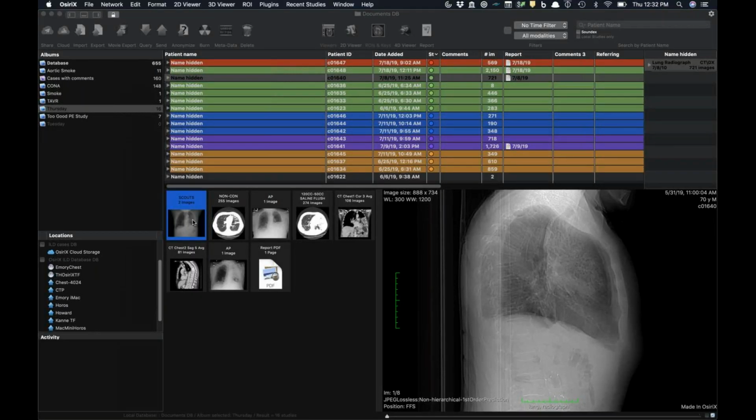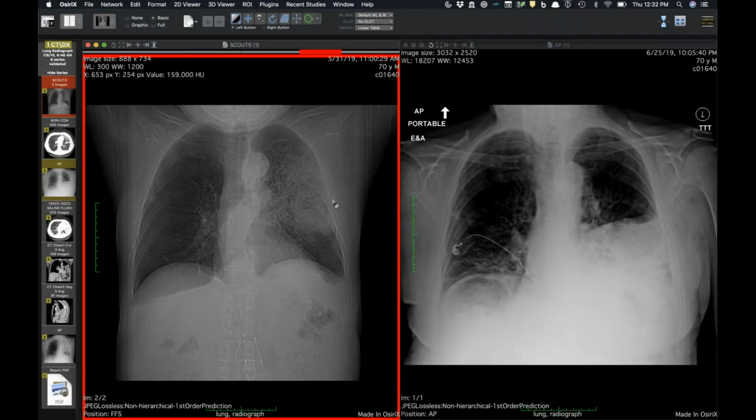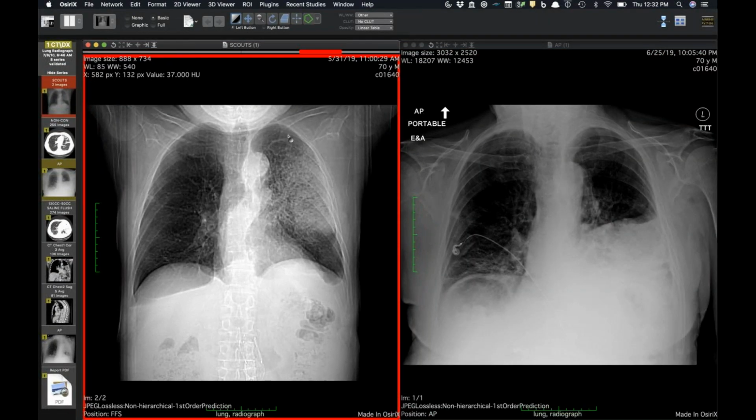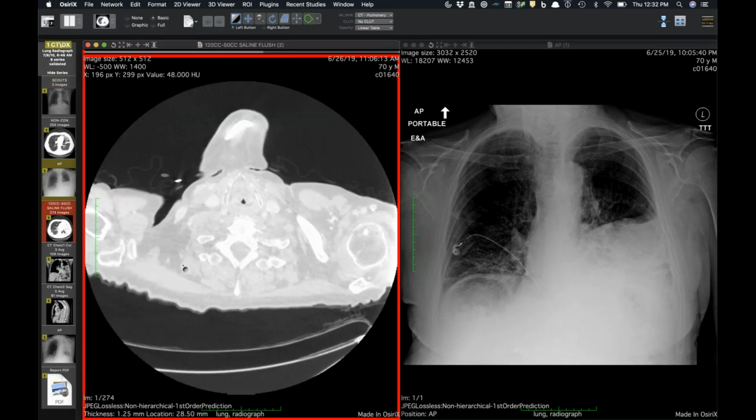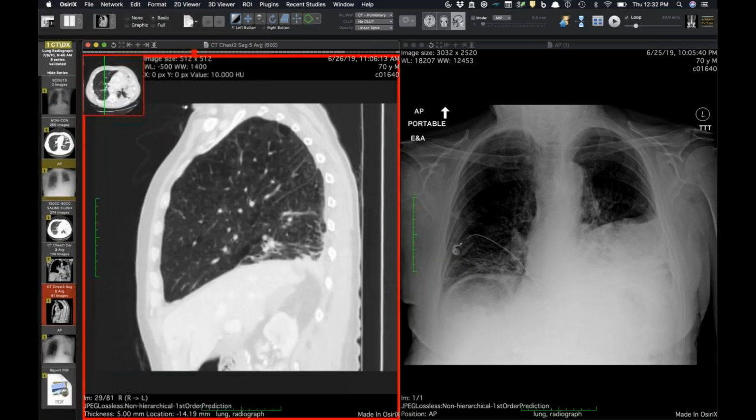So this case, you probably remember from a few weeks ago. This is the patient who came into the VA and was diagnosed with a left upper lobe pneumonia, came back less than a month later, and the left upper lobe had flipped. And so he had torsion, which we thought was from the pneumonia. And this is, I'll show you the CT, the sagittal.